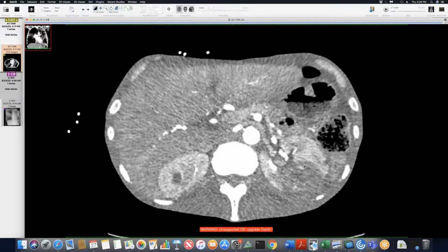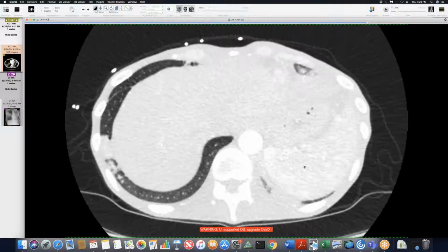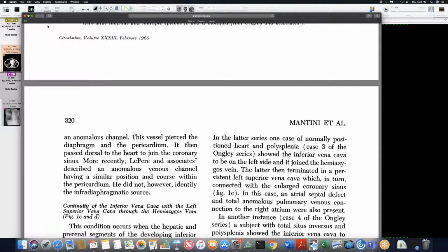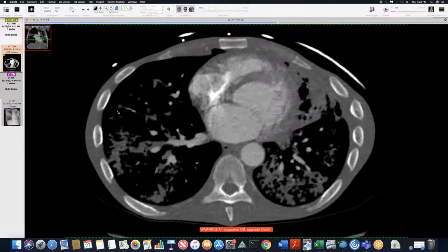I don't know how that's related, but look how wasted he is. He's got no fat. He's got phthisis. He's lost a lot of weight the last few months, but it might be a combination of both the TB and the cancer.